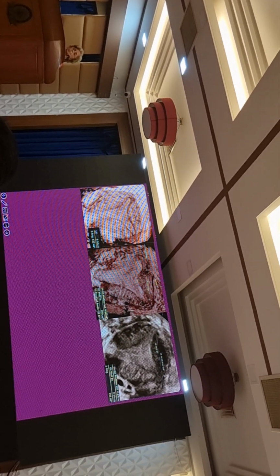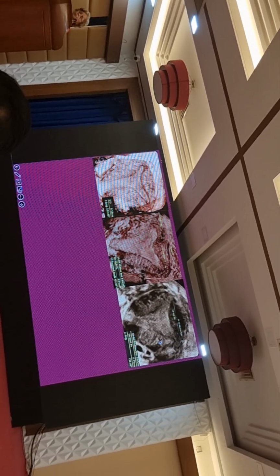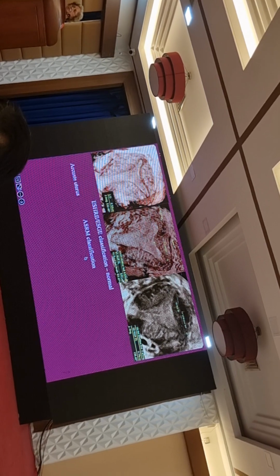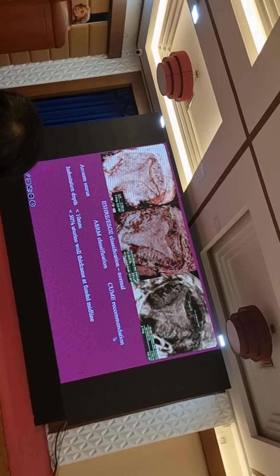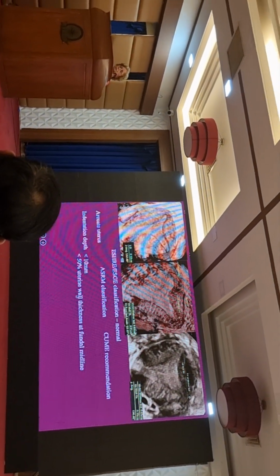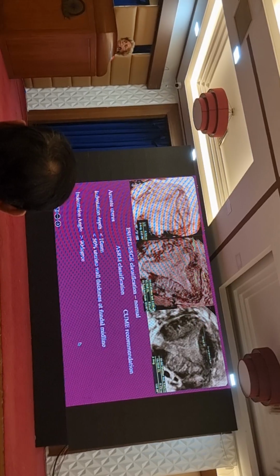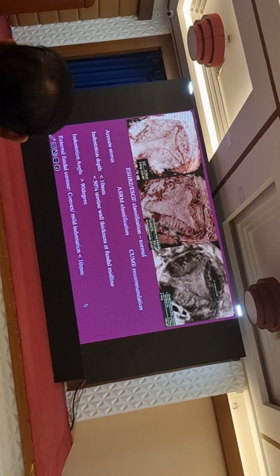These are three different patients which show mild anterior depression along the anterior endometrial cavities, and the fundal contour is normal in all of them. Now, if we look at the ESHRE/ESGE classification, these are all normal uterus. But if we look at the ASRM classification, they are called arcuate uterus. And then what I'd like to do is add this to the CUME recommendations. Indentation depth less than 10 millimeter, 50% uterine wall thickness at the fundal midline, and the indentation angle more than 90 degrees. And that tells us it's an arcuate uterus. And the external fundal contour is normal, and a minimal indentation less than 10 millimeter is considered normal.